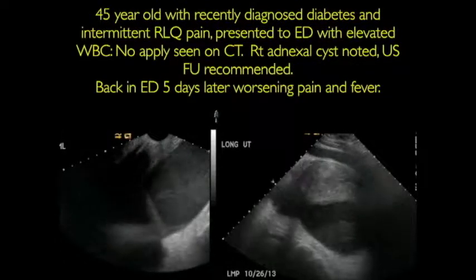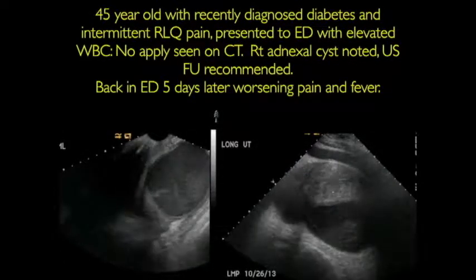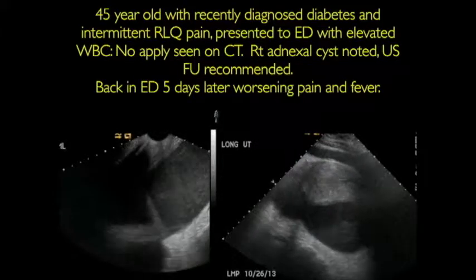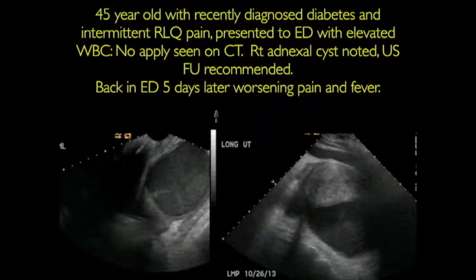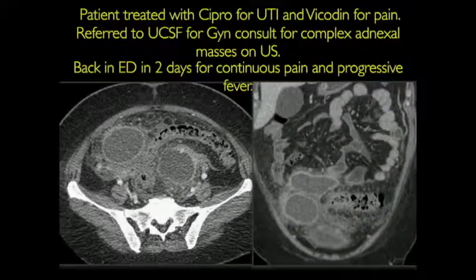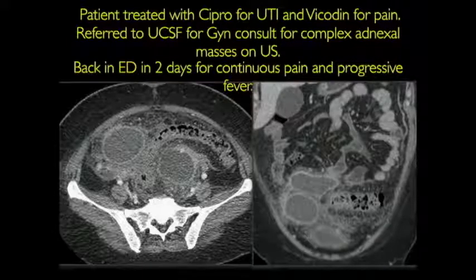So the patient had a follow-up ultrasound. It looked kind of funky, they weren't sure what it was, and they said, well, let's send it to UCSF for a GYN consult. There was a delay in getting the appointment, so the patient again came back to the emergency room, and now we got another repeat CT, and you could see that there is really rip-roaring infection. Now it's involving the adjacent bowel and everything. So this is a subtle pickup on the CT, not to miss a tubo-ovarian abscess.